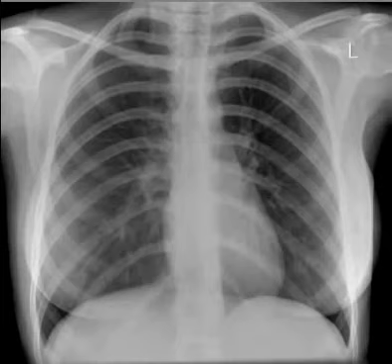Let us try and polish our skills again about radiological features of a normal chest X-ray. First of all, a radiologist will confirm identification, name, age, and sex of the patient. These patient details are provided on the film or on the reporting screen. In this example, of course, these identification details have been removed to keep patient's privacy. The details are matched with the details provided on the radiology request form to make sure that the report is provided on correct film and for correct patient.